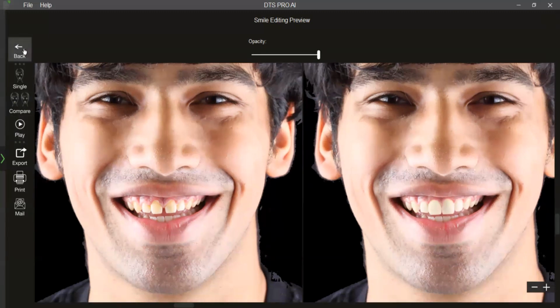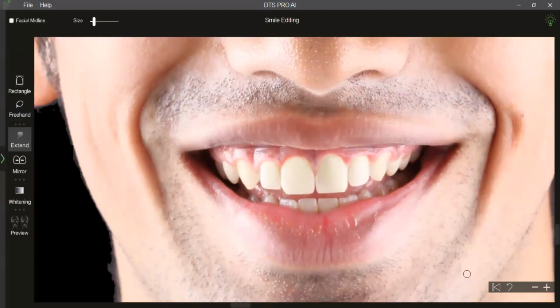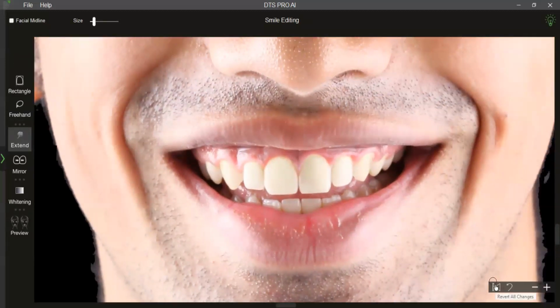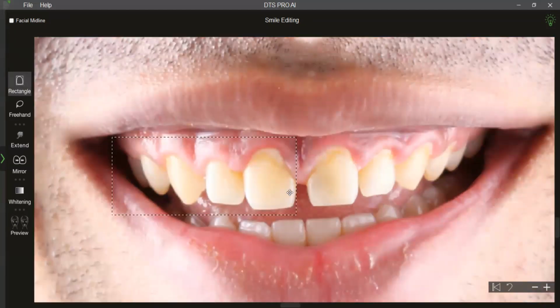I can come back on the screen now for the same patient. Many times we have patients in our office who want to understand how orthodontics, or how tooth movements, would close the diastema vis-a-vis additive dentistry. So for the same patient, instead of selecting a single tooth, I can select the entire quadrant of teeth. Again, making sure that the mesial edge of my rectangular selection is in line with the edge of the tooth. I repeat the process, right click and transform.